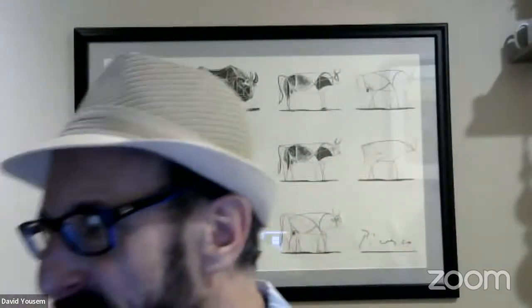Are there any particular aspects of the bone involvement in sinonasal pathology that are specific or should guide our diagnosis? So I mentioned that that bony bar is a pretty typical finding of the patients who have inverted papilloma. Clearly, if you have a popcorn calcification-like involvement of the bone, then you're talking about the chondroid lesions. Remember that the nasal septum is mostly cartilage, and therefore you have enchondromas, chondrosarcomas, and benign chondroid lesions of the nasal septum that can occur and will point to a specific diagnosis. From the standpoint of other sarcomas, osteosarcomas, or Ewing sarcoma, no specific imaging features in that situation.